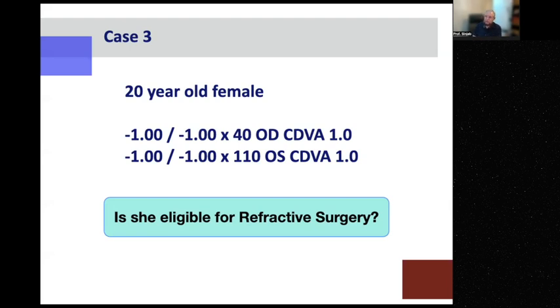Thank you very much. And this is the answer for Dr. Muhammad Jasser. Can we do cross-linking then refractive surgery? No, because this is not keratoconus. Askar says, should we consider the abnormal curvature map even though astigmatism is less than 1.5 if the skewed radial axis is high? Just ignore the skewed radial axis. Don't look at it.